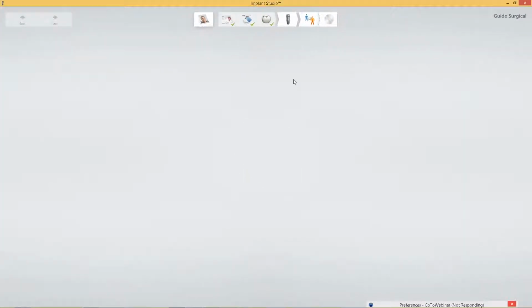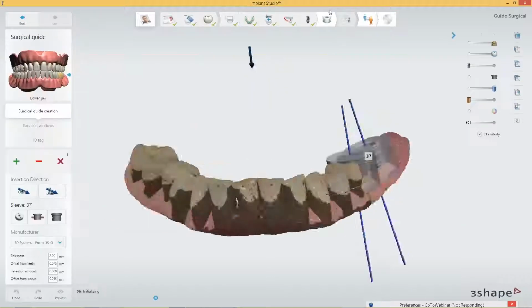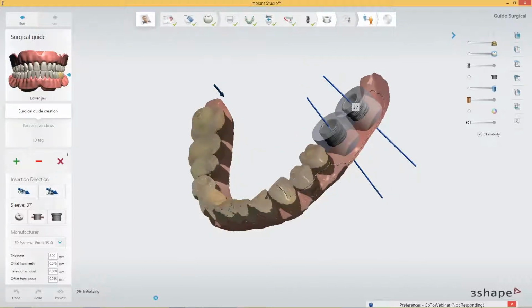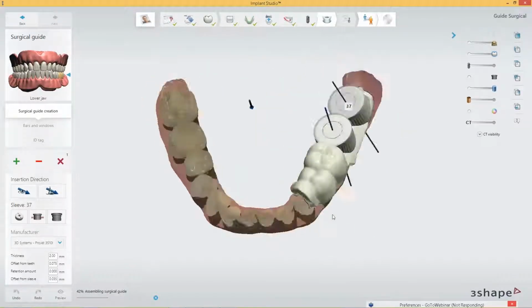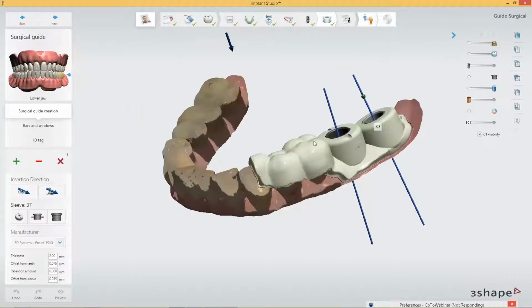And then I can go back to my planning stage, of course, and complete the rest of the process. Here I just haven't completed designing of the drill guide. I've made a plan, but I haven't completed it, so software will load everything as it was earlier on. Usually this shape will load up in a matter of moments. It's not very big, it's not very complicated.